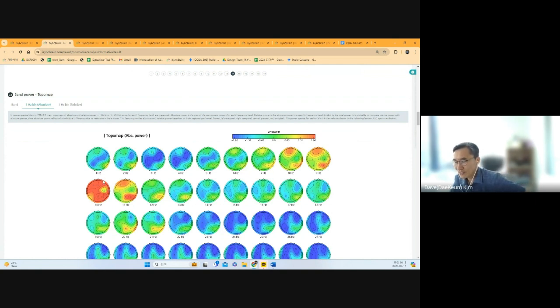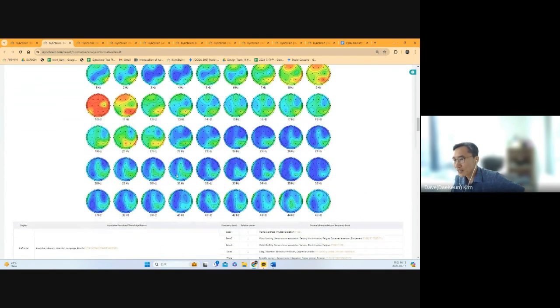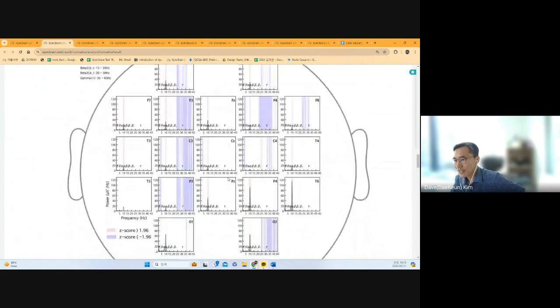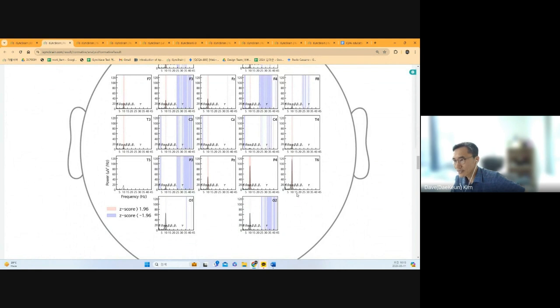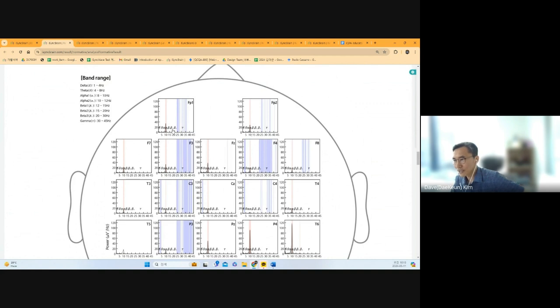In the case that there is a global fatigue pattern and also emotional trauma and frontal alpha excess, this is the typical depression pattern of the QEEG. And we can find the deficiency in beta activity. In the spectra, you can see the T6 alpha is largest, and the P4 is also larger. And you can see the frontal alpha is also excessive.